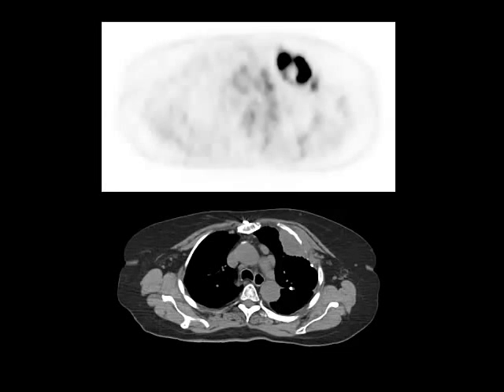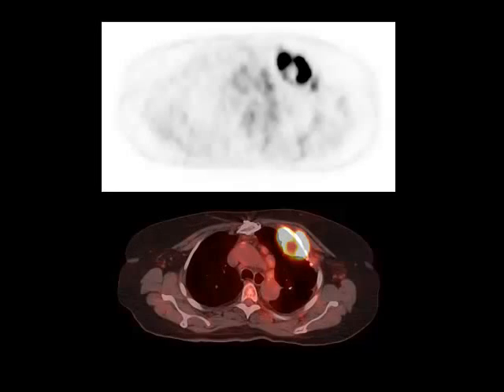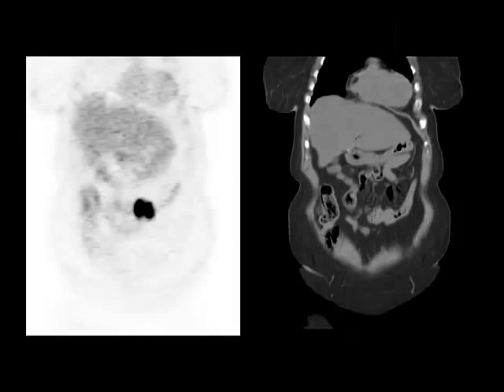So on this image, we can see here's the primary lung carcinoma, and with PET-CT, we can nicely see that this is invading into the chest wall. If you go forward one. We found that PET is actually quite helpful in some of these cases where the anatomic differentiation is difficult, to see whether this is merely abutting the chest wall or perhaps extending beyond the chest wall. But in this case, we can see the metabolism clearly extends through the chest wall into the subpectoral space.